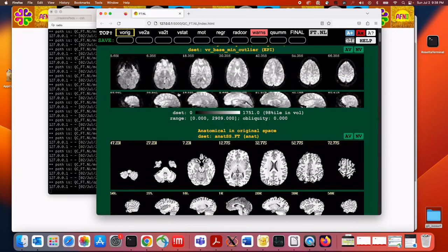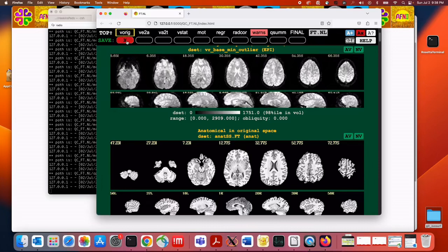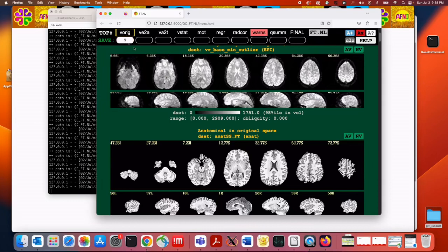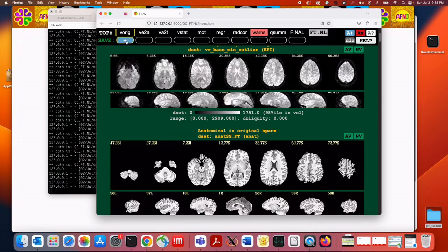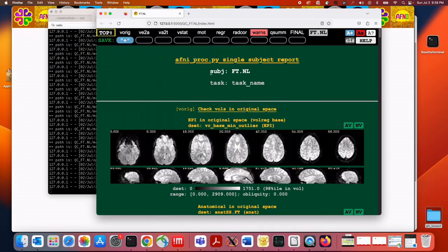But we can go over here and say, is this good or bad? And say, okay, this looks good to me. So let's say I'll put a plus there. But if I didn't like it, I could put an X, and if I weren't so sure about it, I could put a question mark. And if I do Control or Command click on a Mac, so this is a Mac, so I'll do Command, I can enter a comment about that and say, all looks good here. And keep that and close it.